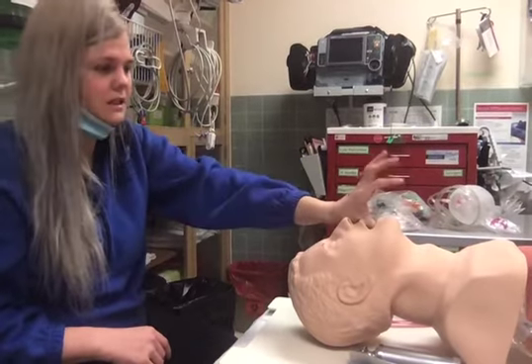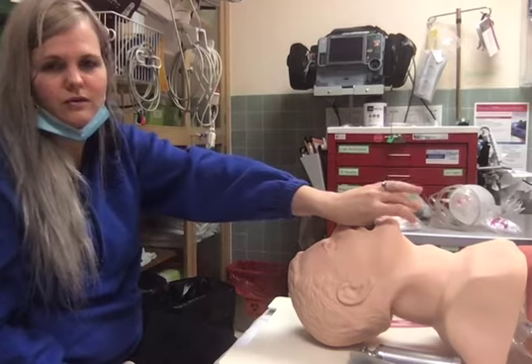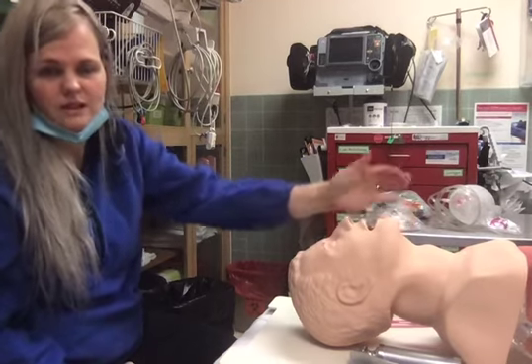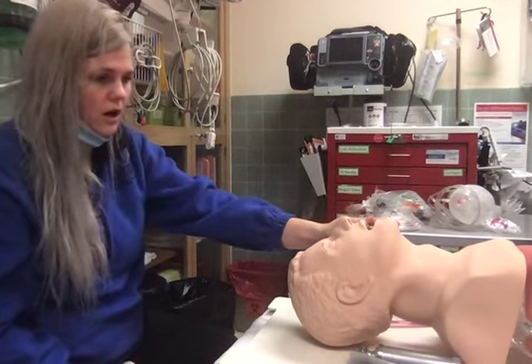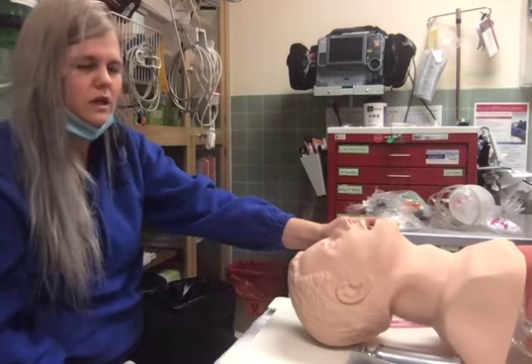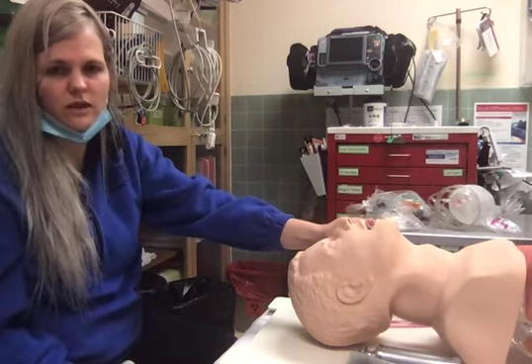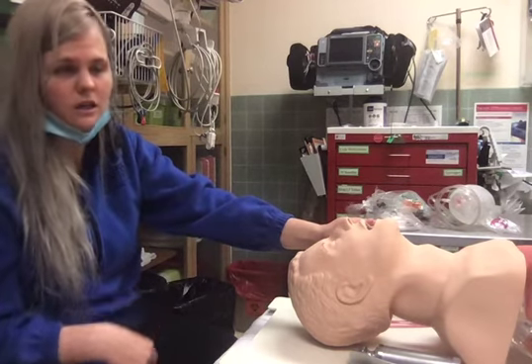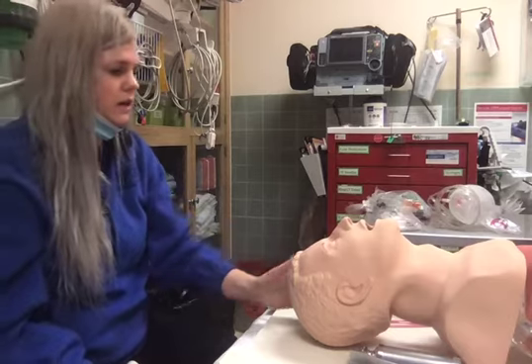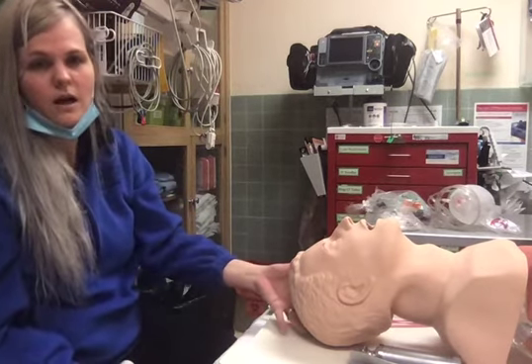So when you place an ET tube, you have quite a few things to consider, but you do have a few benefits. It protects the airway from aspiration. Anytime that we have any sort of overdose, any sort of intoxication that decreases the level of consciousness, we're definitely looking for that just due to our nature of flight. In the ER, you could be a little bit less aggressive when it comes to those tube placements.